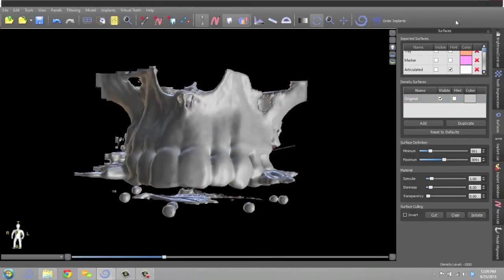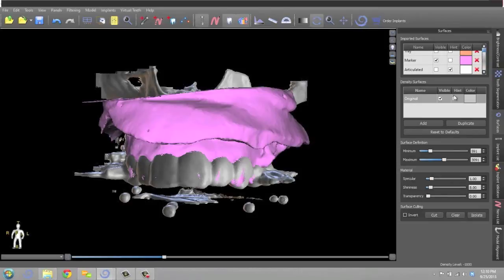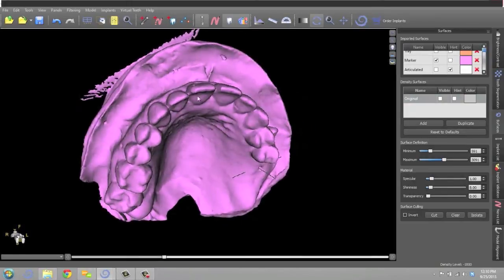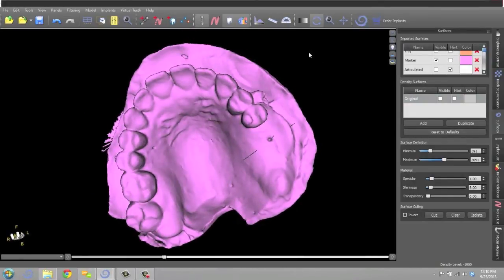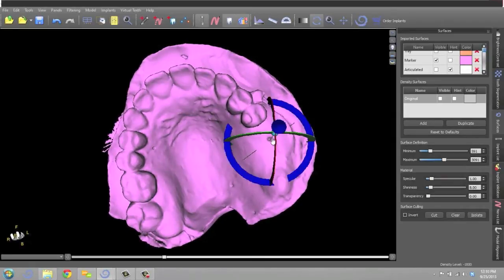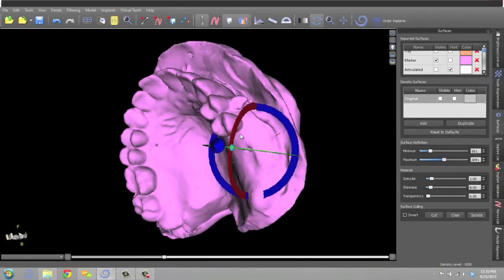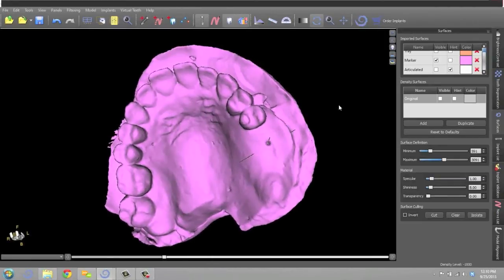And then we scan in, as you know, we scan in models for you. Okay? So the models that are important to view would be marker. I'm going to turn off the patient scan. And when we say marker, and this is something that you should train yourselves to do, when I can, I'll put a little divot in the model in the ideal location for the implant. Like this divot is probably 5.5 millimeters or so, 6 millimeters distal to this bicuspid, which is about the right spot for a molar implant.